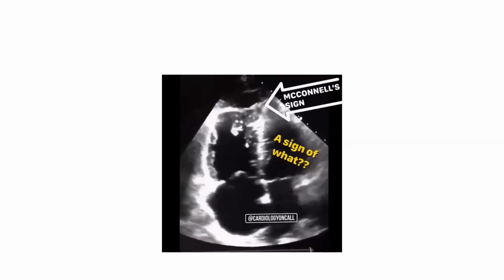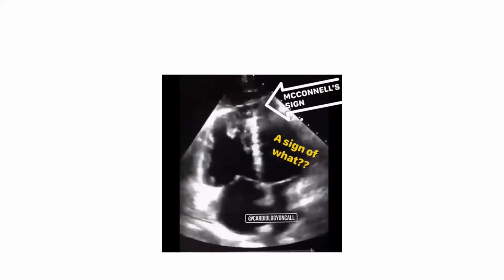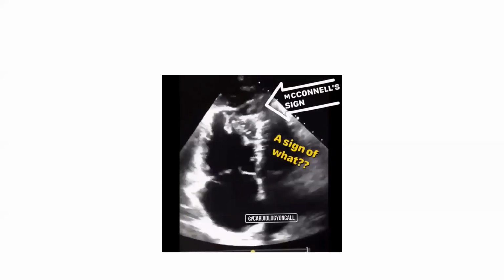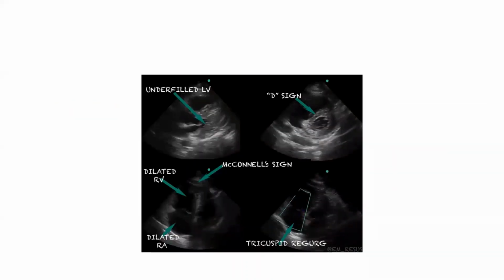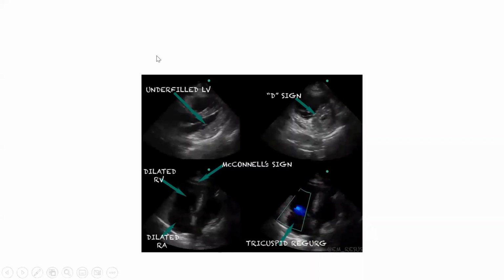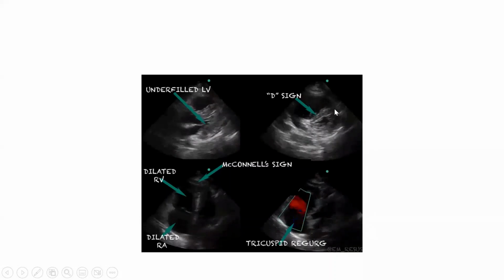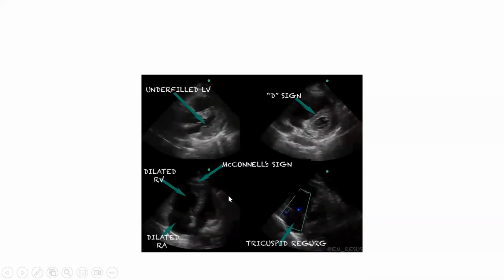But with pulmonary embolism, the RV is unlikely to be good and is likely to be impaired, so it is unlikely to have a TR signal that leads to a gradient above 60. Okay, good. So the dilated underfilled LV, the D-shaped sign of the LV, the dilated RV with apical sparing, and the tricuspid regurgitation.